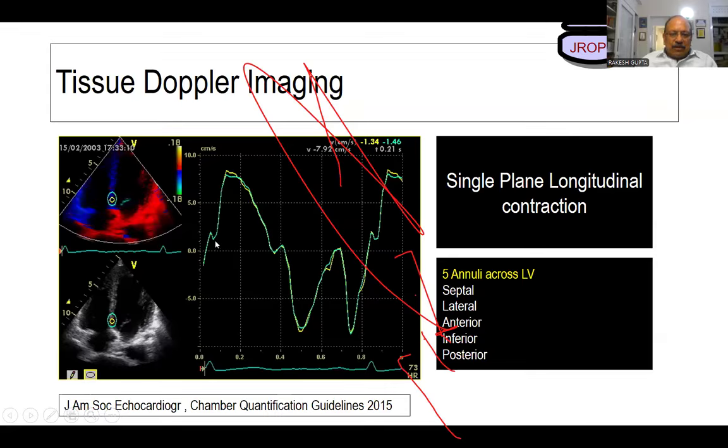from this point to this point. Then the systole happens. This is the systolic interval. Systole happens, stops. Then before the diastole happens, this is the isovolumic relaxation time from this point to this point. Then initial emptying, diastasis, it will kick and go back to the beginning of systole.